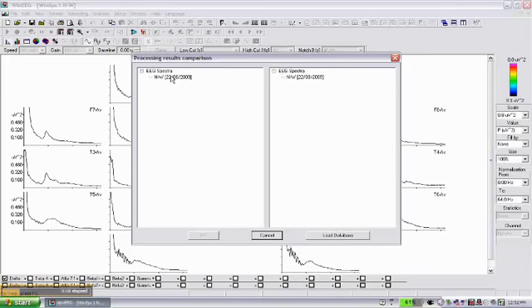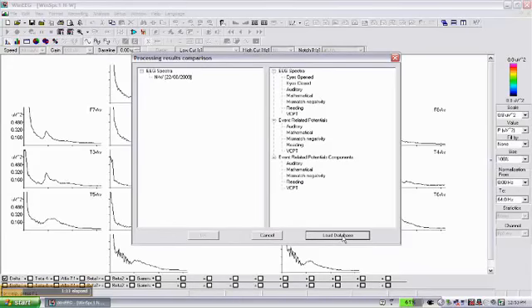And we are now using one of the possibilities. We upload the data from the database. So we click load database, as on the right in this window you can see different options. EEG spectra computed for eyes open, eyes closed condition in 5 task condition. Because we compute a spectra for the task, we select VCPT task and we just click OK.